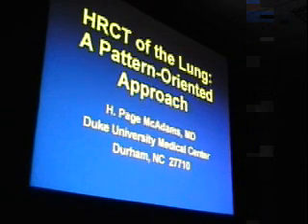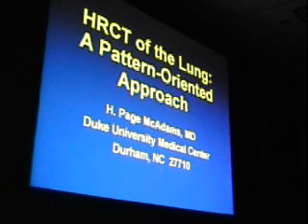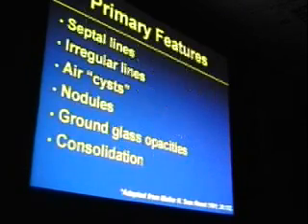Okay, Dr. Raven's just given you an elegant introduction to evaluation of interstitial lung diseases on the plain film. Suffice it to say that we know the plain film is integral for both detection and differential diagnosis, but high-resolution CT has become really the mainstay for evaluation of suspected interstitial lung diseases, and certainly is viewed as such by our clinical colleagues.